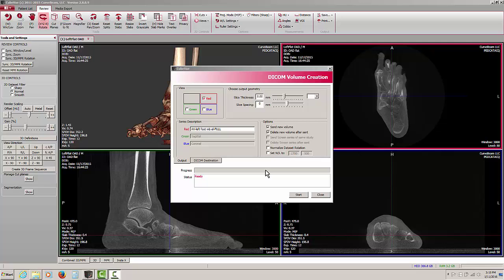Now, when we open these images in a third-party viewer, such as a PACS viewer, and we find that we have to regularly adjust the window and leveling, for example, they're always too dark or always too light, we can check this box that says Set Window and Leveling to, and make some adjustments to the default window level settings. That's going to go into a DICOM tag. So we're not actually changing the image itself. What we're telling the viewing software is if you use these window level settings, you'll have a minimum amount of adjustment to do once you've opened images from the pedCAT.